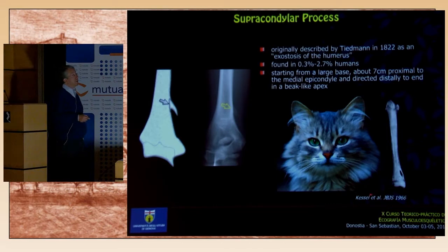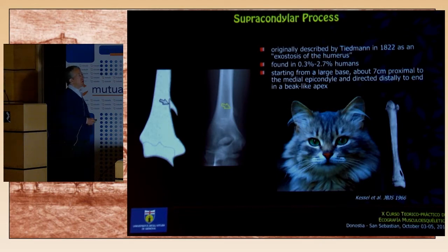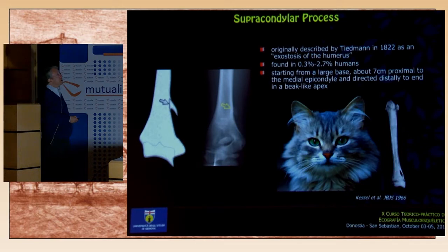And these kinds of animals have an accessory muscle on the medial aspect of the arm. So we have the triceps posteriorly, the biceps anteriorly, but in cats, for instance, we have the latissimus condyloideus, an intermediate muscle between the triceps and the biceps, going to insert just here, at the level of the ring you see in this image, and this is part of it, and probably re-expressed.